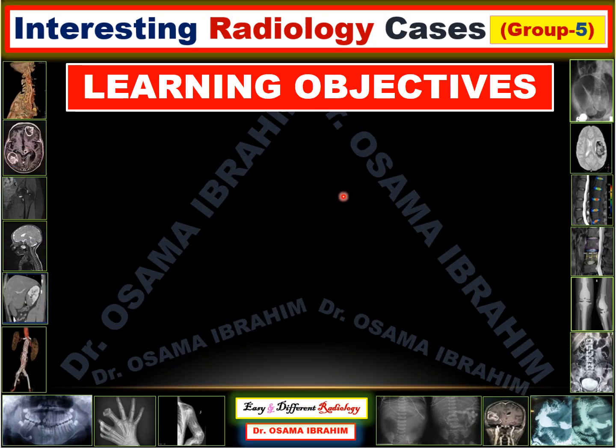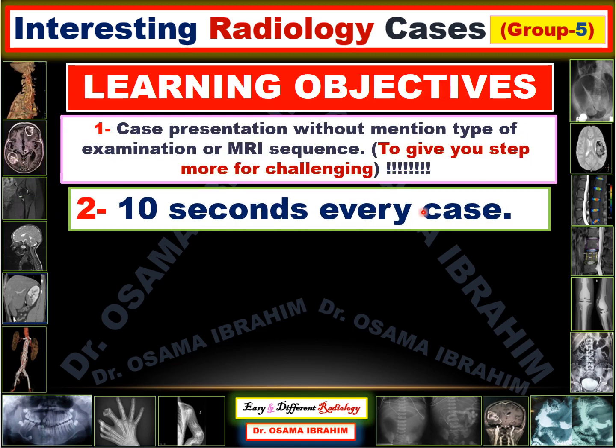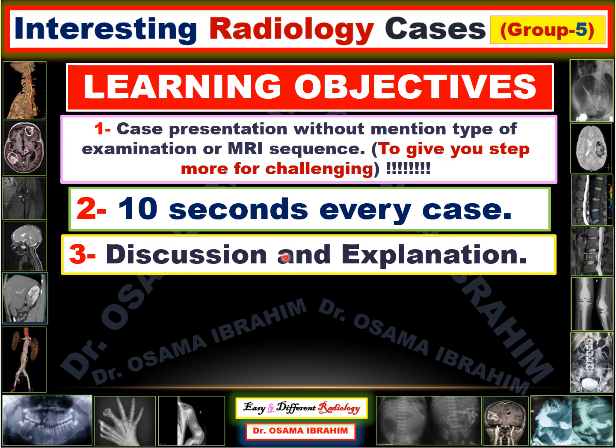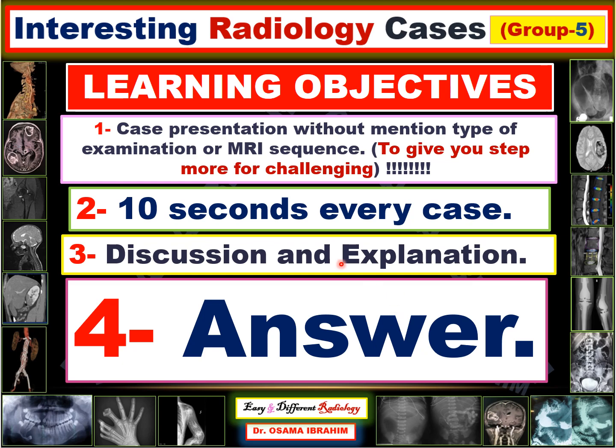As usual, I introduce the case with clinical presentations and give a chance to know the type of exam. After 10-second intervals, you can describe the findings, the suspected differential diagnosis, and the final diagnosis. After that, I will make a discussion and explanation, then give the answer and final diagnosis.